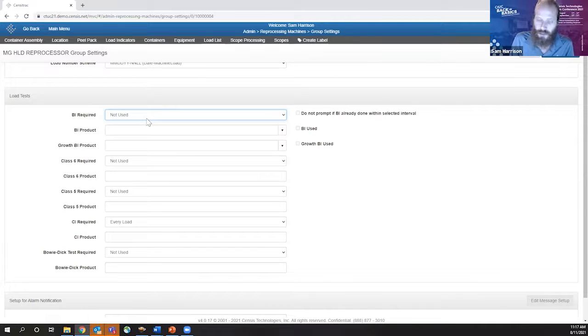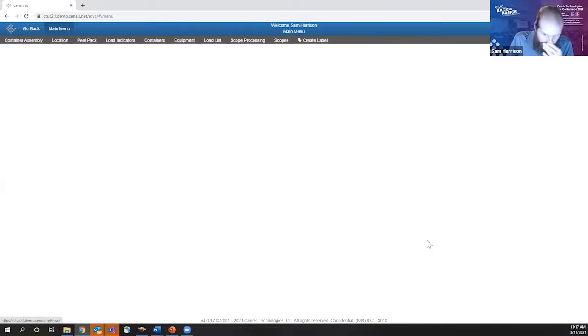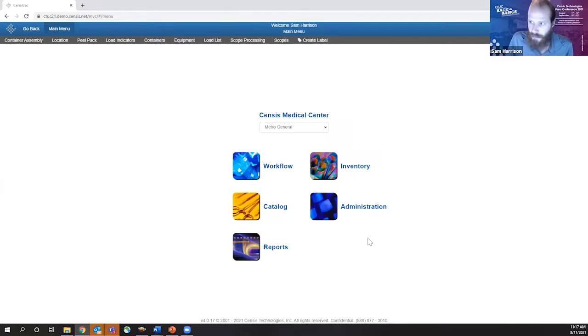And I think that'll make more sense when I show you that CtTUC Advanced, if you haven't seen it already. But also, Aaron, besides the ways that Kelly listed out, another way you could do it is the quality feedback module. The quality feedback module is very easy to use. You may be familiar with it already. I can just take 30 seconds and set this up quick.